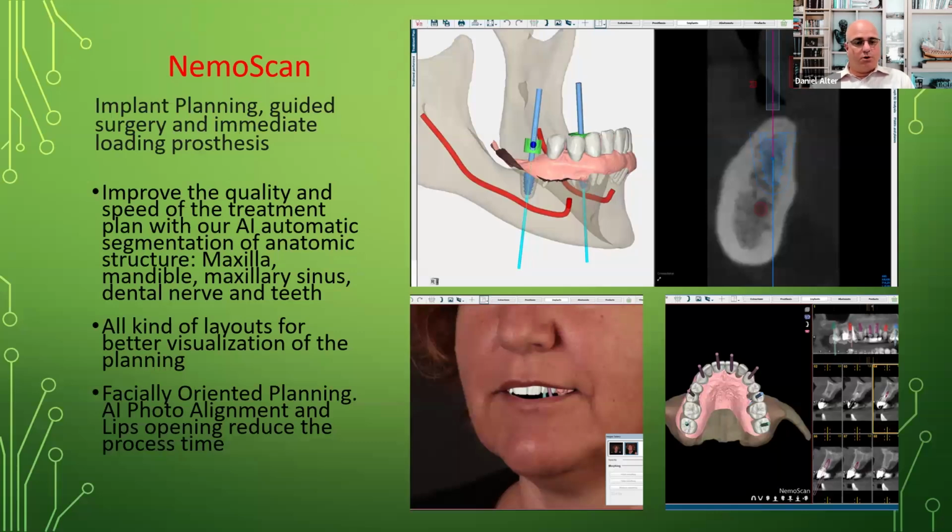But by doing so, we're also placing it under where the prosthetic will be. So now we can really be in the driver's seat and control the outcomes from before we even get started, which is a very powerful mindset and a method of doing it. So we're not reactive in the way we've traditionally done it, where we have to restore the implant supported prosthetic, whichever way the access hole ended up.